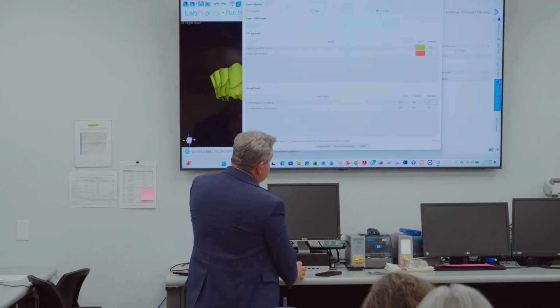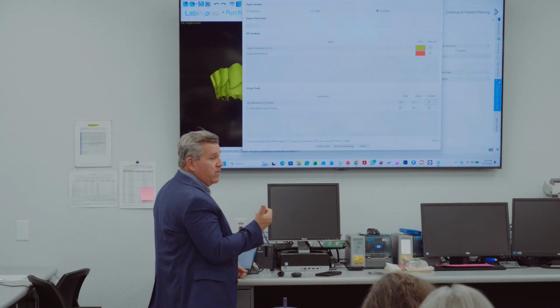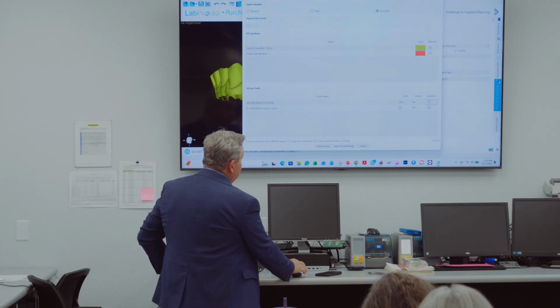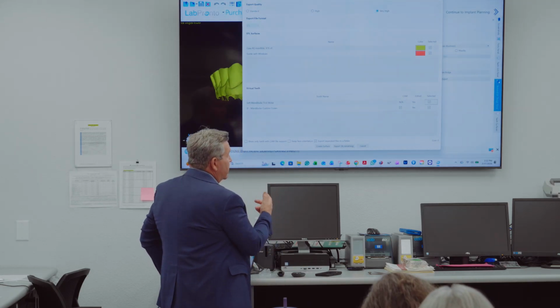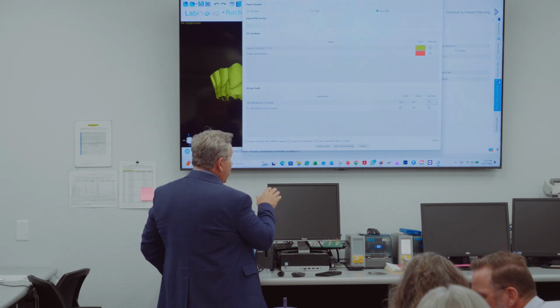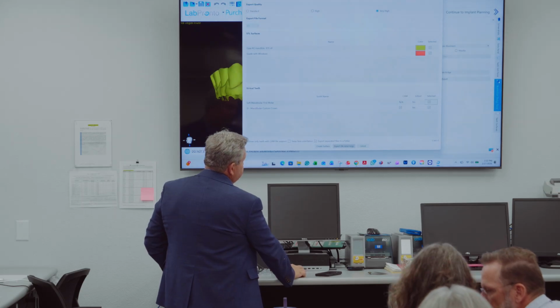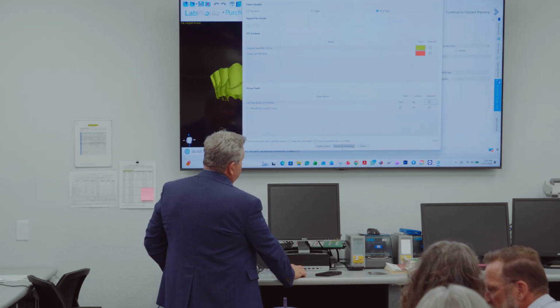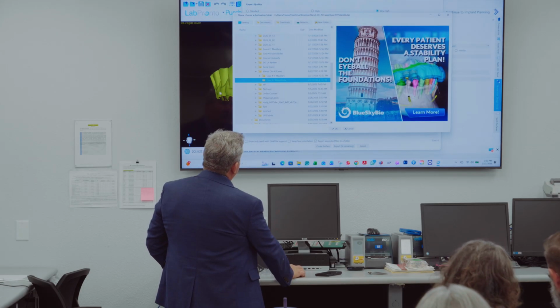Now the crown, at this point, you could order the tie base and do a zirconia or an acrylic crown as a temp. A lot of people do that, they'll temporize it and print that on a printer. Tomorrow they're going to talk to you about single crown printers, where you can do one crown at a time. Here's where it gives you the exports remaining, right down here. If I'm going to do this, it asks where do you save it? It's going to do it back to the mandibular file.